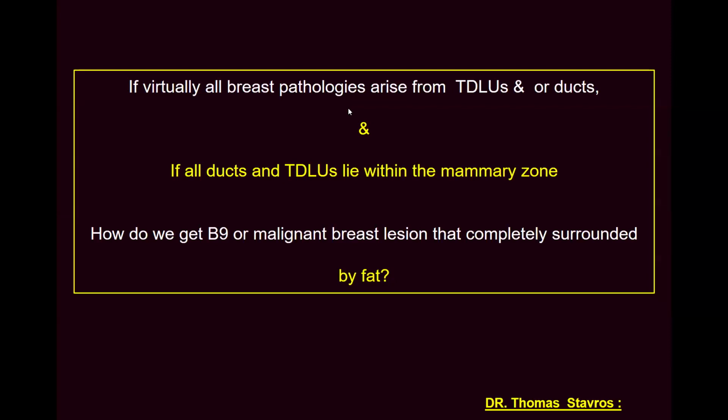Any suggestion? It is difficult. It's difficult by margin to define, to characterize. Yes. It is difficult. Difficult because both benign give angular margin. Benign, and I'm not talking about the angular margin now. I'm talking about the surrounding fat.